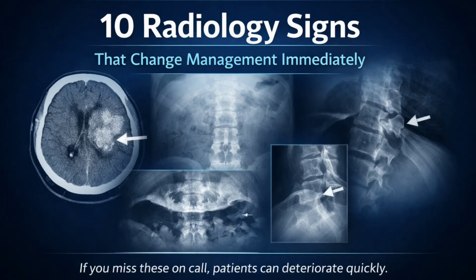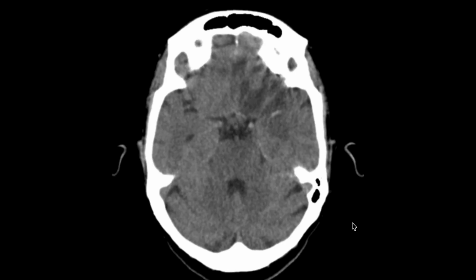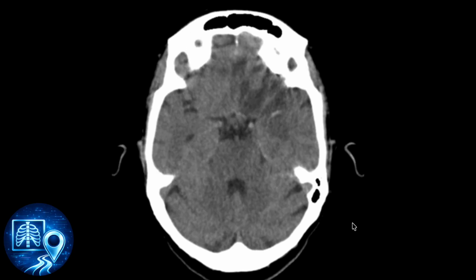These are 10 radiology signs that can change management immediately. If you miss these on call, patients can deteriorate quickly. Let's go through them. First, the hyperdense MCA sign.